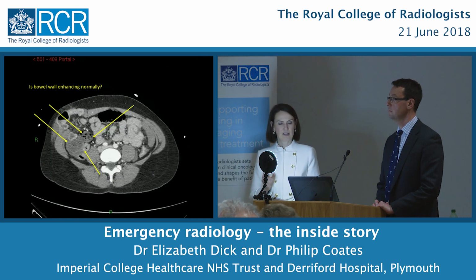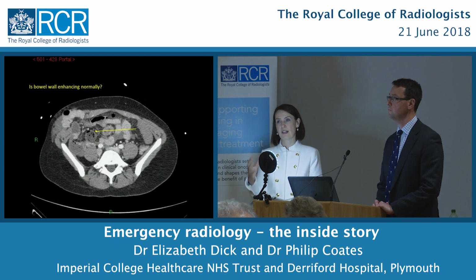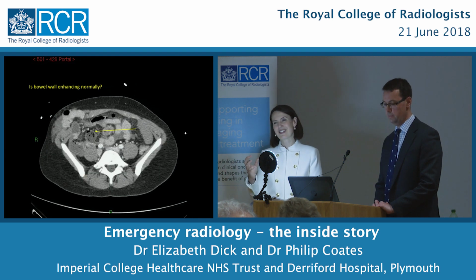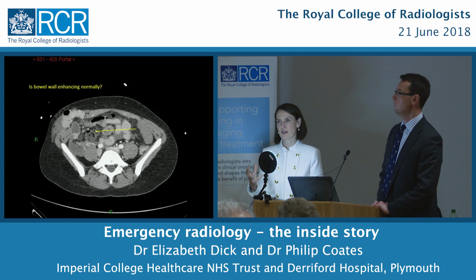But then come a bit further down and you appreciate that the loops of bowel that I've arrowed are not enhancing at all. So they're very dark, the walls, and there's this kind of funny air material within them which doesn't look right at all.